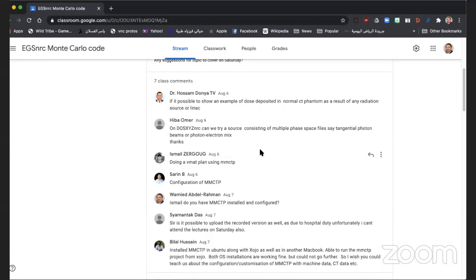Dr. Hiba, but basically the basic idea is you need to get CT images, and then you need to create a text file that has the names of all of these images, because we need to generate a phantom for those XYZ, a CT phantom. And that is how it's done. You need a text file with a list of all the files, DICOM files, and then we will use CT create.